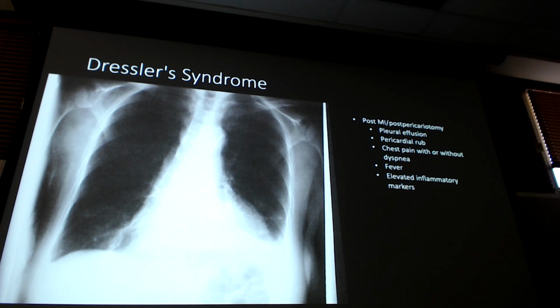Primarily on this side right here, the blunted costophrenic angles. Okay? This is what I want to stand out to you guys, so I know we can't do our stepwise process. And if I were to ask you if this was an adequate chest X-ray, you would say no. What is this trash? I can't do what I need to do for my systematic process. But in this particular case, it's really great at showing the blunted costophrenic angle due to the pleural effusion.